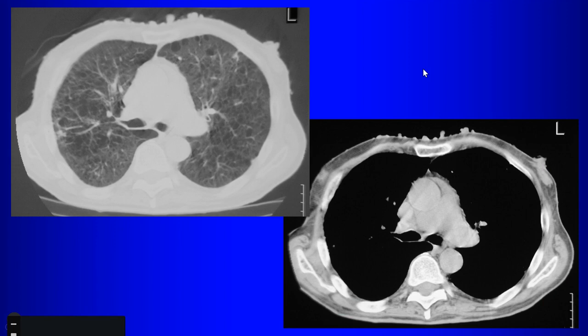This patient also demonstrates an unusual finding in the lungs that can also be associated with neurofibromatosis. What is that? Cystic lungs, yeah, these cystic changes within the lungs, so it kind of resembles emphysema, but these cysts in the lungs can also be associated with neurofibromatosis. That's unusual.